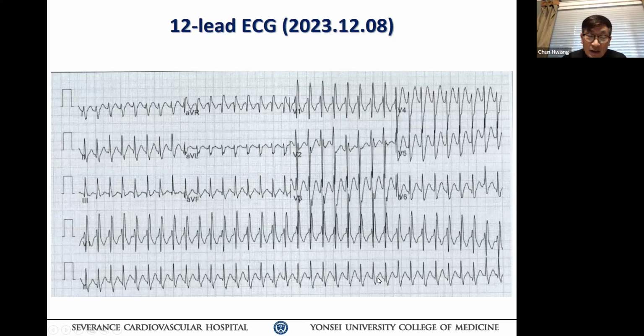In SVT, you could not have that because this is repolarization, the absolute refractory period as well. So you should not have any change in deformity unless there is some second wave hidden inside, which could be a dissociated P wave. If the SVT was a regular tachycardia, your T wave shouldn't be changing from segment to segment.